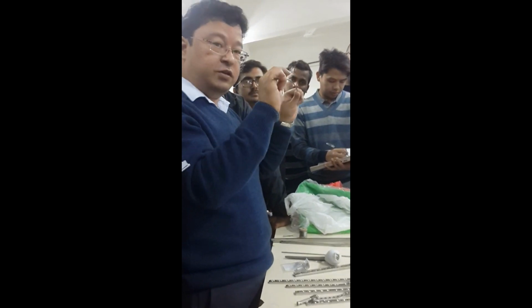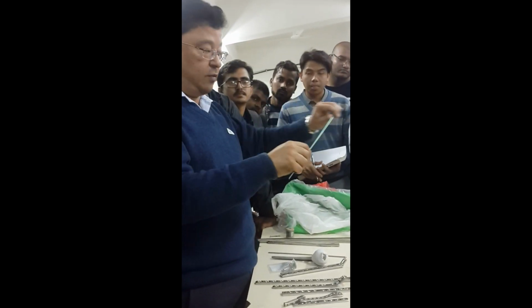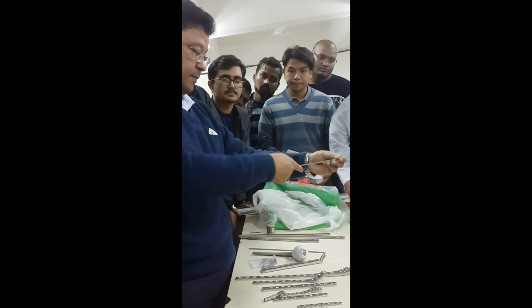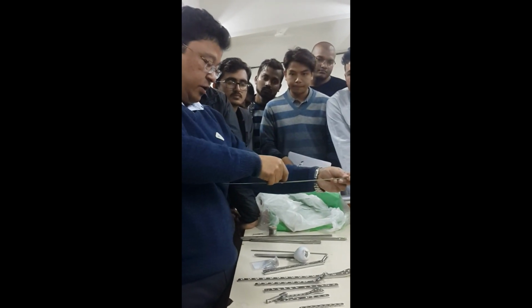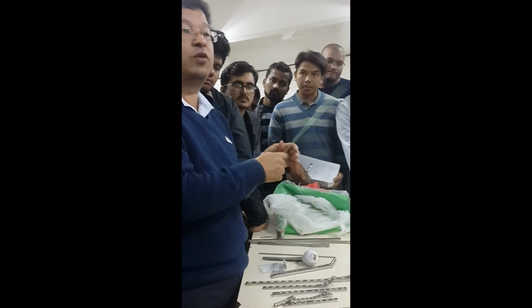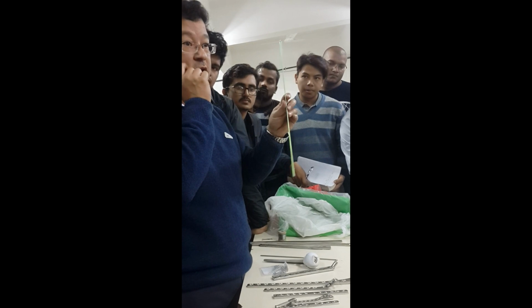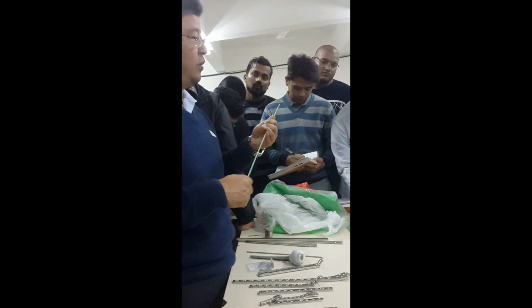Three bony point fixation. The principle, even in the plaster cast also, is three bony point fixation. Suppose it's bent like this, the other comes like this. One point is here, one point is here, and here. Ideally, the fracture should be here. So it's a three bony point fixation. Nowadays we use this because of early range of motion.